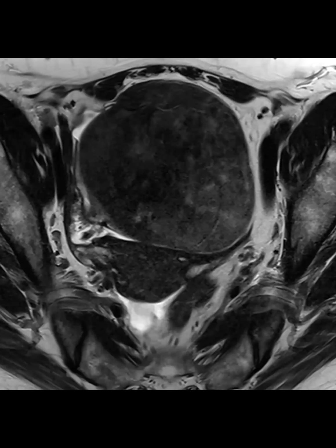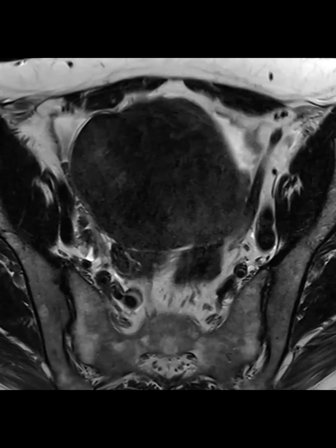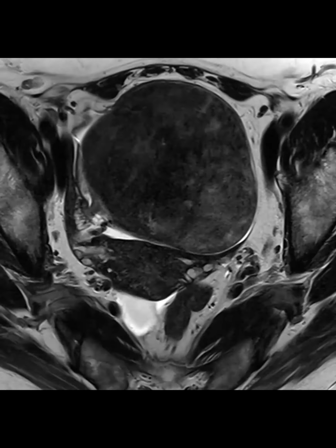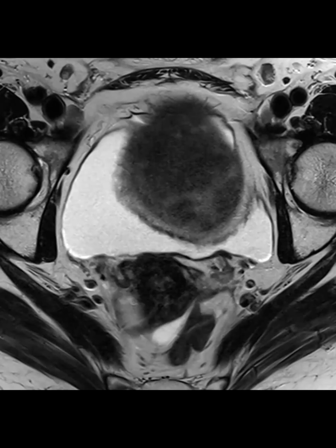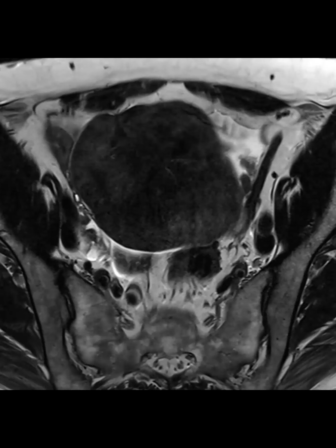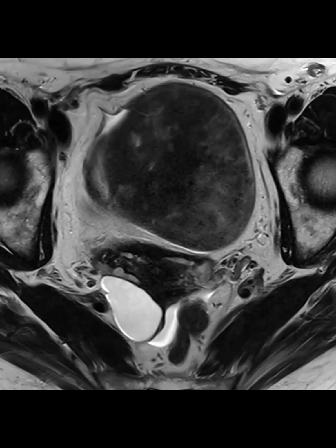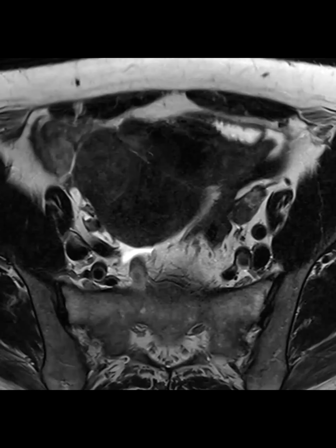And then let me see if I'm showing the case actually for the incidental finding, but the left ovary, where did the ovary go? Did I see it? Yes, right ovary I saw, left ovary I saw as well. But if we think it's coming from that right ovary, then we're thinking fibroma. Yeah, exactly, along that fibrothecoma spectrum. Yep. And surgical path is pending.